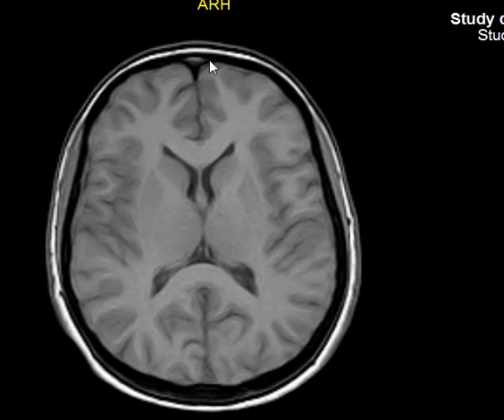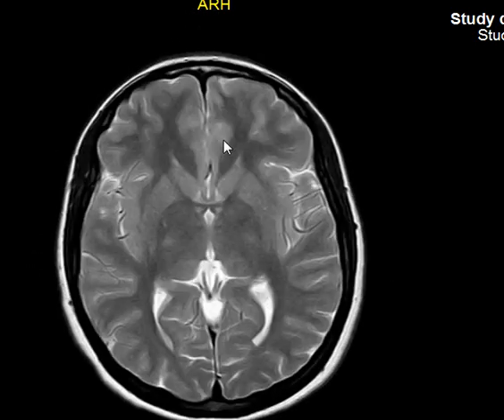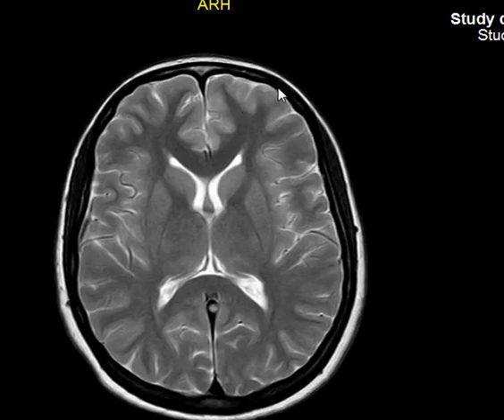So far okay? Good. Let's see on the T2. T2 loves what? Fluid. So the gray matter contains more cells. Cells contain water. So it appears what? Brighter on T2 weighted image, while the white matter contains myelin, which is fat. T2 does not love fat. So what happens? It appears darker on the T2 weighted image. Okay? So now we agree that this is the gray matter and this is the white matter. How the gray matter appears on T1, how the white matter appears on T1, and how the gray matter appears on T2, and how the white matter on T2, and why.